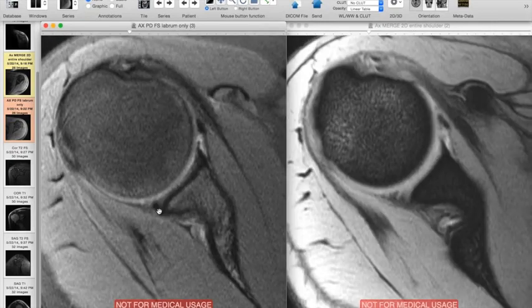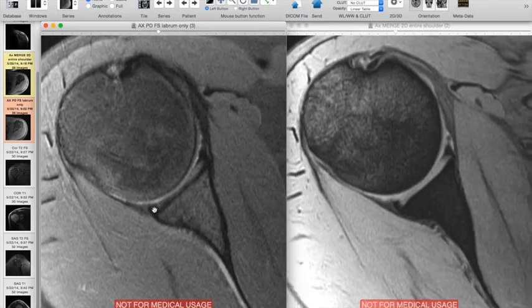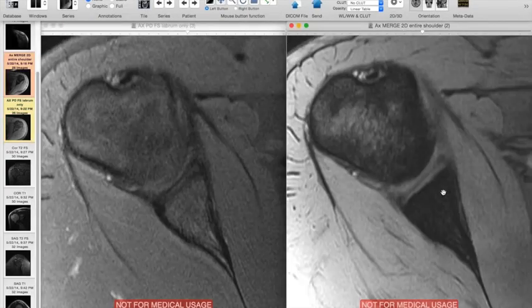Posteriorly, the labrum is often a little bit blunted and less round, maybe a little bit smaller than the anterior labrum. So here's the posterior labrum in this patient, and you see those pretty nicely on the gradient echo images as well.